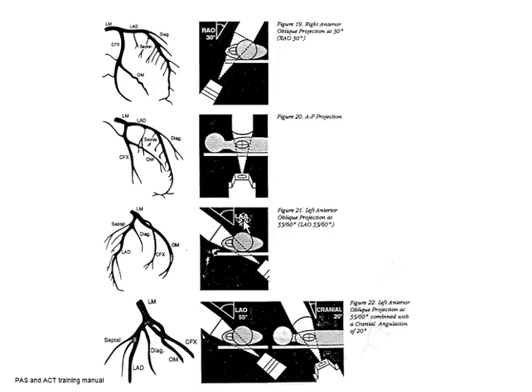More angles showing you nicely how the angulation through the different parts of the heart gives you these orientations. And the LAD with the septal perforators, diagonals, and the rotation of the heart and the LAD, and here the spider view. You should really understand the spider view by now. I would think the RAO and probably the LAO and the LAO cranial for the LAD. And for the circumflex, that view of the heart in profile shows the circumflex nicely.